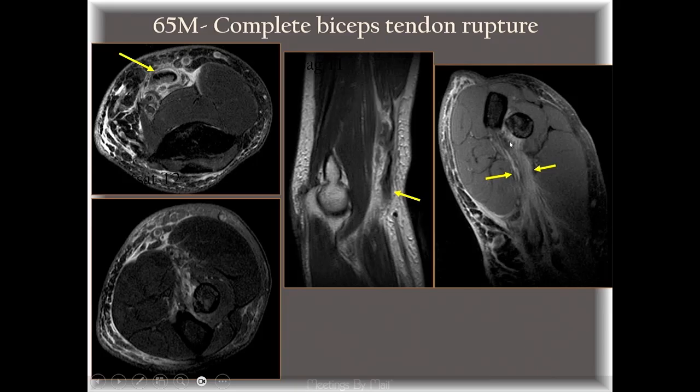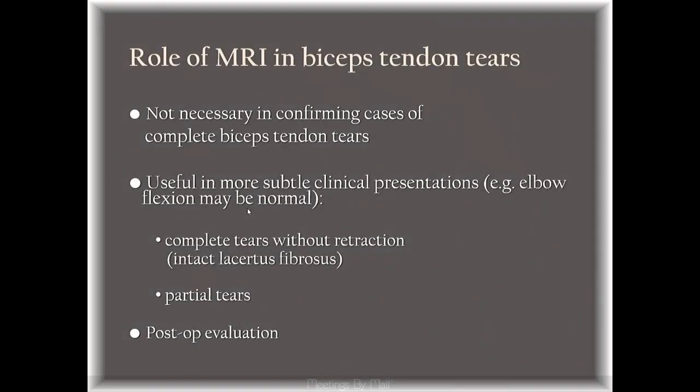This is that FABS view. We don't do it at our clinic. Flexed elbow, abducted shoulder, and forearm supination. So that's when basically it's like this, and so you're coronal to the biceps tendon. It makes it easier, but anyway, I happen to have a FABS view for this case. The tendon is all the way here. This is no tendon, nothing attaching. So it really makes it easy to measure, but you don't really need it. It just makes it easier.